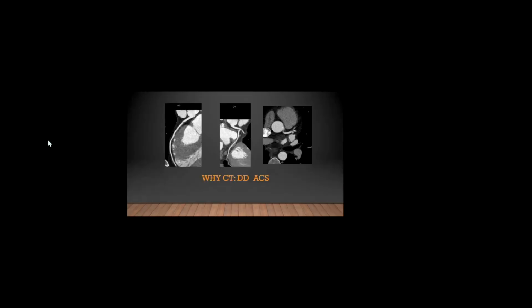There are some other differential diagnoses that might present in a way more or less similar to acute aortic syndromes. For example, if there is acute coronary syndrome, we saw on the gated study, in this case, a 28-year-old coming with chest pain. It was query aortic dissection, but later on the dissection was in the coronary. It wasn't in the ascending aorta. So we could see that is the ascending thoracic aorta giving the left main, and the left main here in this case is trifurcating. So it's giving the left anterior descending, ramus intermedius, and that is the circumflex.